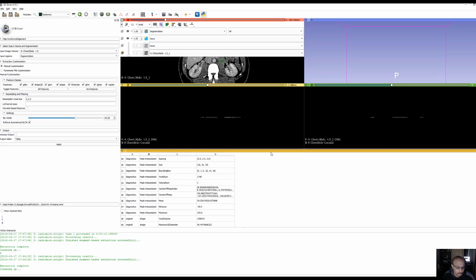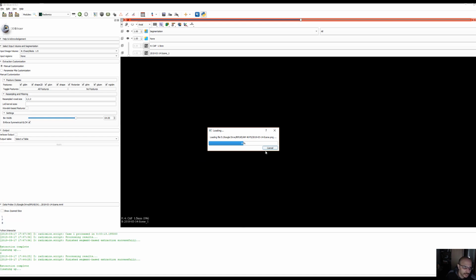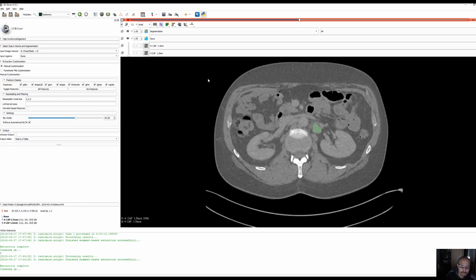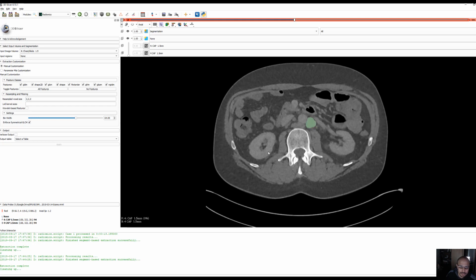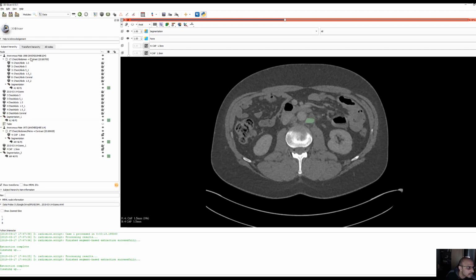I'm going to remember all of that. It's important to keep track of all the names, because as you add cases, Slicer will store the old ones in its system as well. So that looks fine. I think that is a different case. Yep. So now once again, I've got another segmentation. Interestingly, if I go back, then I can see that you have now added a case. So that's going to make things a bit messy, because you've got segmentation here, but I can see that you've got an identifier, so you've got to remember that the one we're looking at is this.